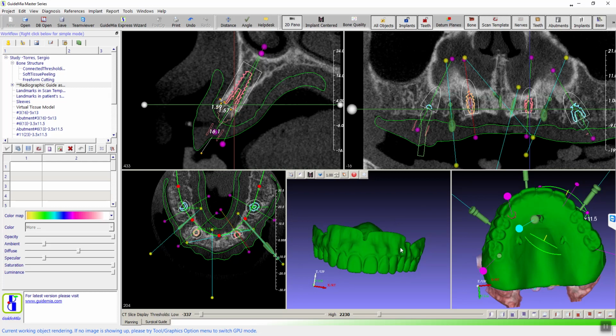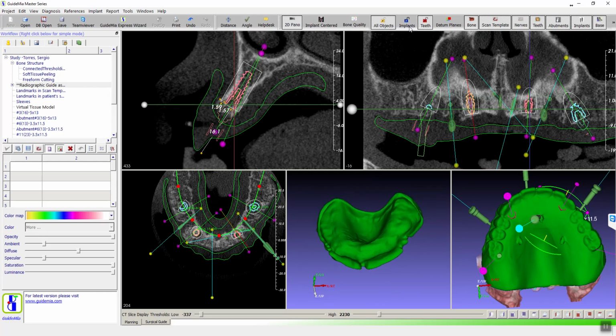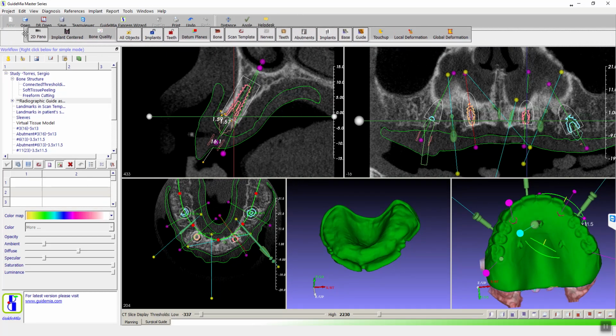The flange is too short. There's no space for the anchor pins, for whatever reason. So in that case, we have additional functions to fix that. If we look here in this toolbar, let me drag this one lower.